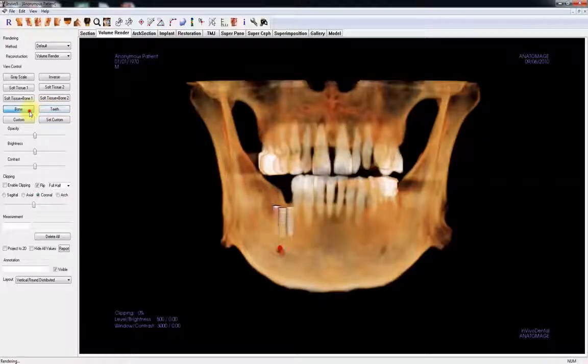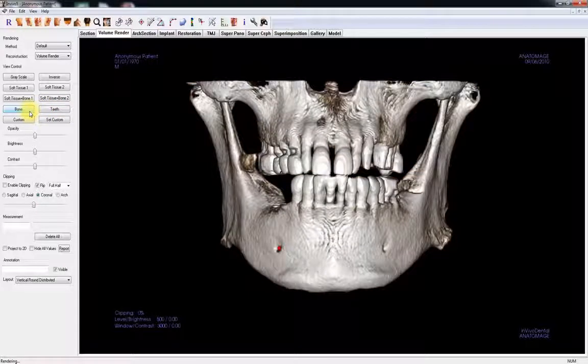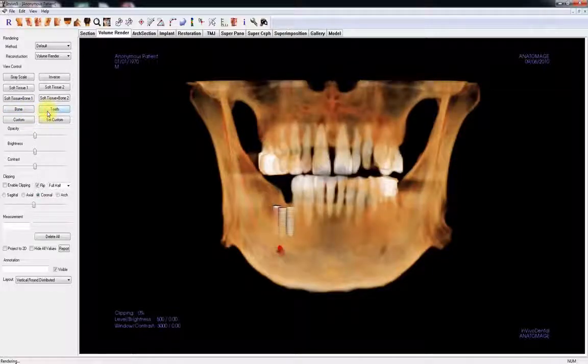The bone view is opaque, which shows the bone surface better, and the reflection of light and shading generates a 3D perspective. The teeth view can be used to view the root and internal structures, as well as abscess and root and bone issues.